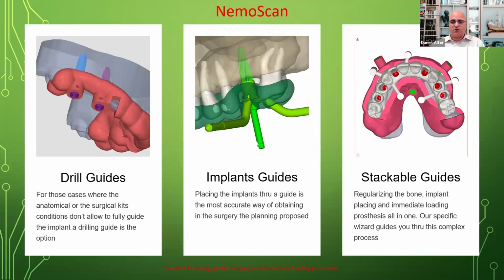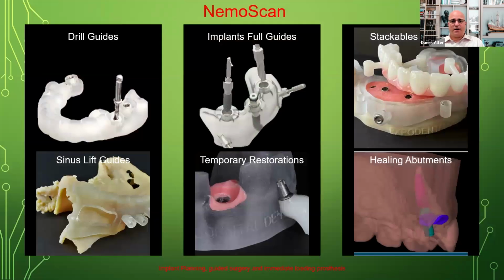So it's really a tremendously robust software, as I said. And here you have some more examples of the drill guides, the implant fully guided, stackable guides, the healing abutments, the temporary restoration, as well as the sinus lift guides. So what you can do and what you can accomplish, and I'll show you the drill guides as well as the implant full guides, and the healing abutments that we were able to do, as well as the temporary restorations.